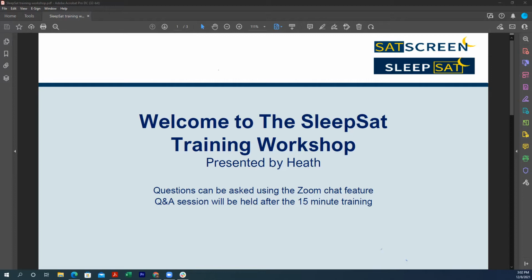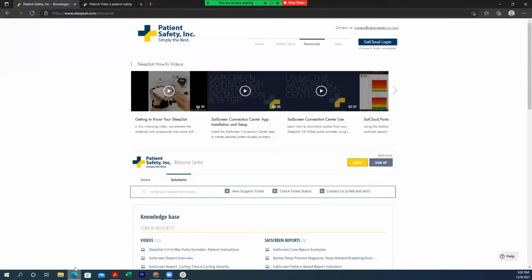So to get started, I'm going to go to our website, sleepsat.com/resources. And here at the top, you're going to see our SleepSat how-to video series. That includes everything that you're going to need at the beginning, how to use the SleepSat device and how to get the Connection Center installed on your computer, all the way to a little bit more advanced stuff of reading the reports.